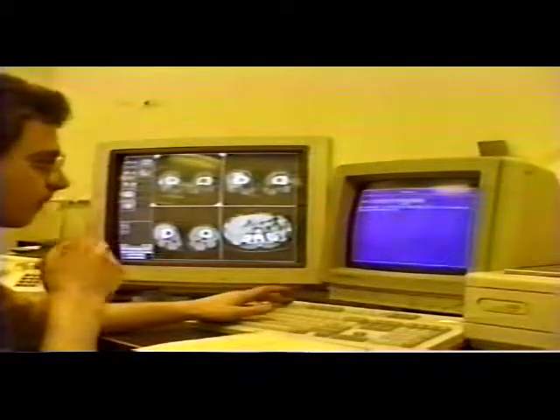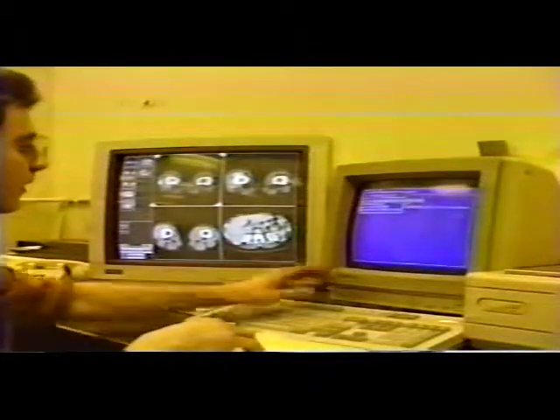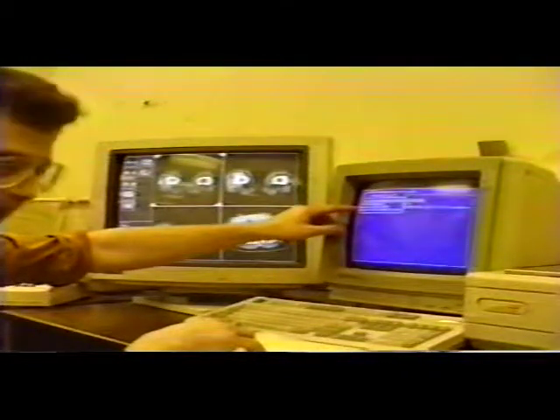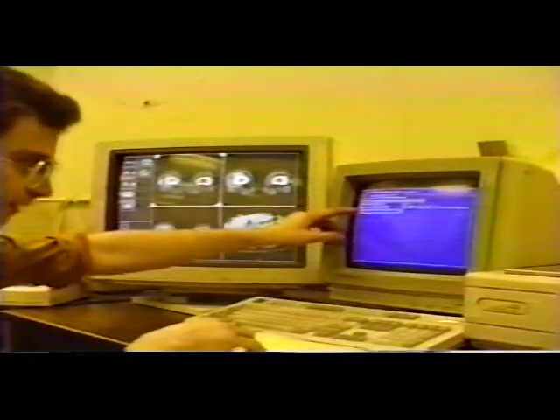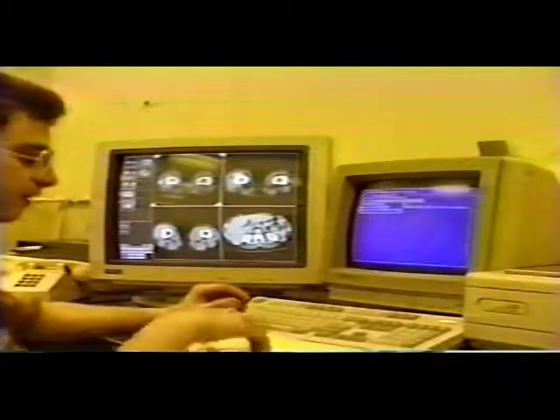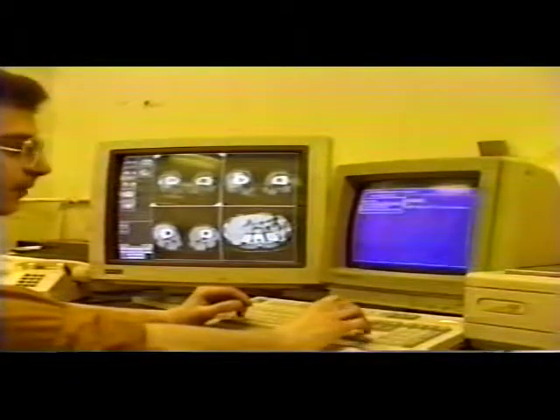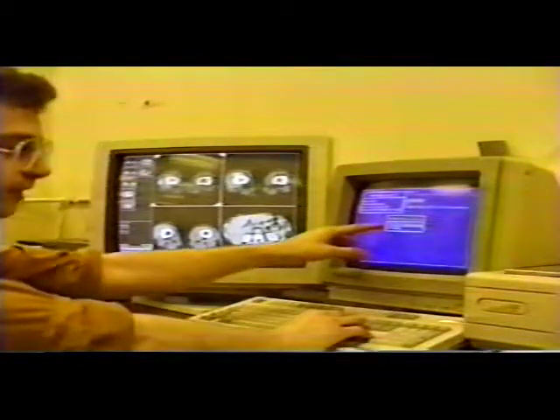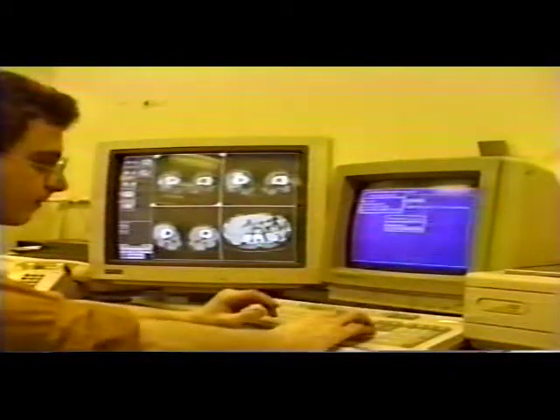There's a print button for printing out these reports. You get a list of whether you want to print the report only, the selected image only, the report and the selected image, or the report and all the images in the study. That moves up and down. If you want to print an image, you can print just a common field, or you can print all the fields.